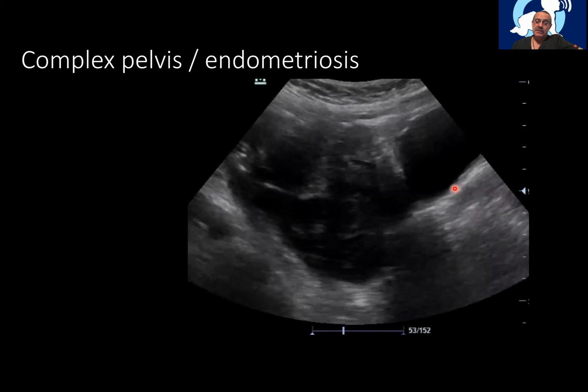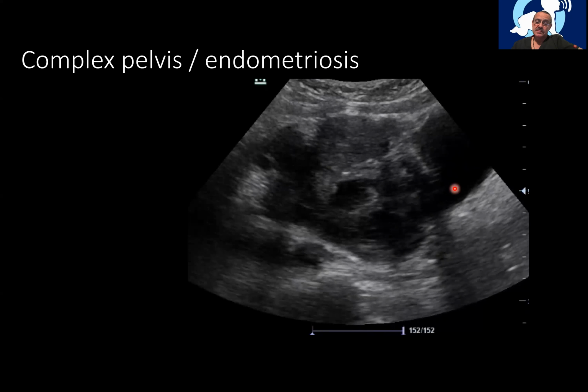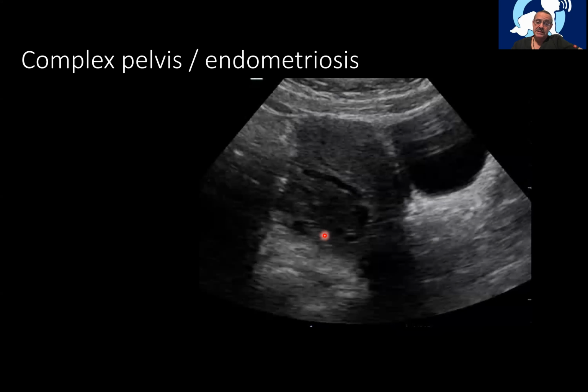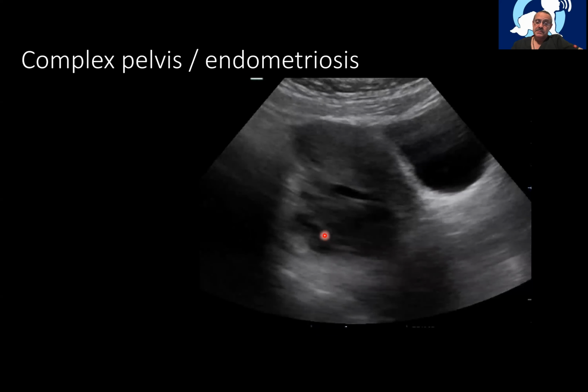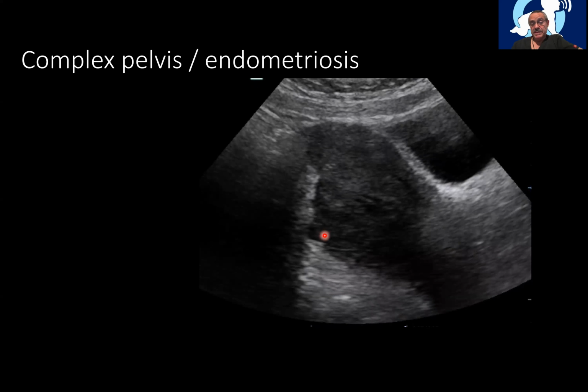Why is this not an ovarian tumor? The number one complaint is pain, not weight loss, bad shape, no, just pain. Pain during menstruation, dysmenorrhea, which has been increasing through time since she was young, and a complex pelvis. That's not cancer, that's chocolate inside. That's precisely like menstruating inside.